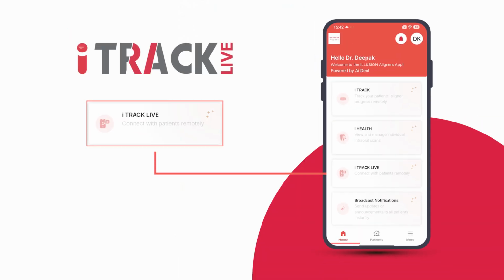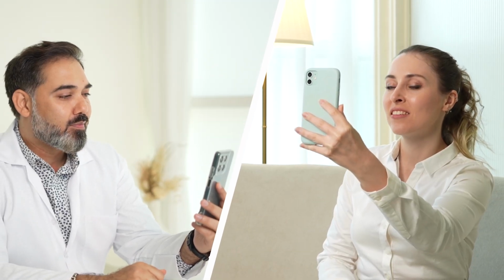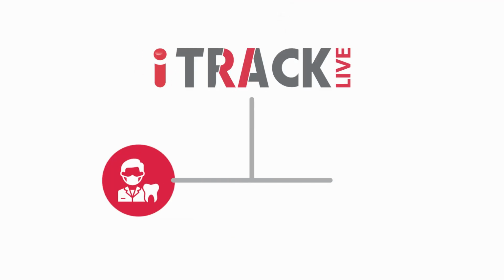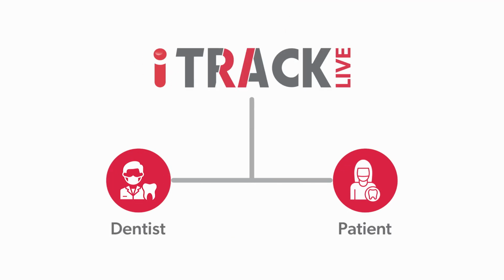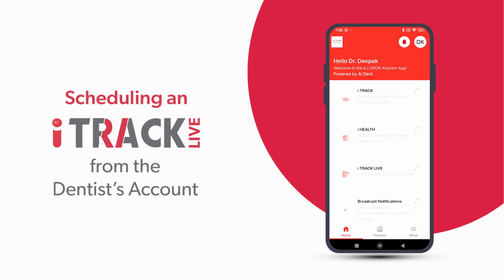Hello! Let's learn how to use TrackLive, a one-of-a-kind AI-powered intra-oral virtual consultation innovation for remote dentistry. Let's explore all of its aspects one by one. A TrackLive can be initiated by both the dentist and the patient. First, let's explore how to initiate a TrackLive from the dentist's account.